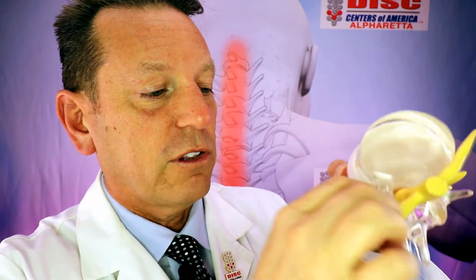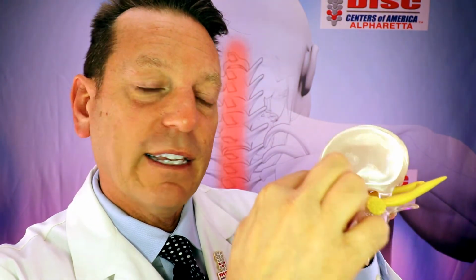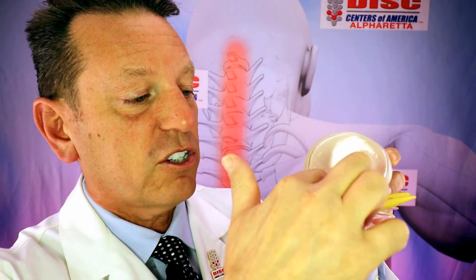These areas are called the lateral recesses, which is a big fancy term for where the nerve branches sit in a little tunnel where those nerves can come out. Most of the time when a disc bulges or herniates, you're usually going to see it happening out in this area or this area, because there's a very strong ligament that sits right in the middle of the back of it that usually keeps it intact.